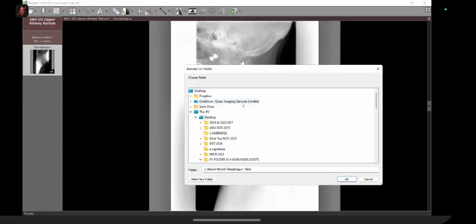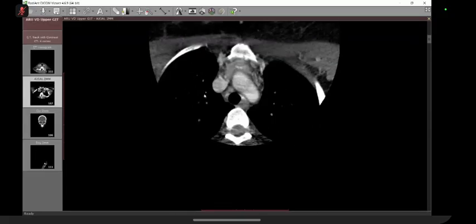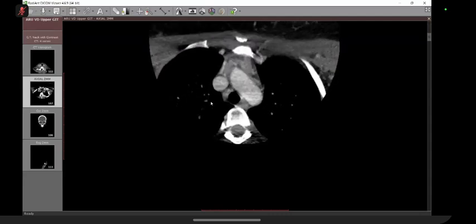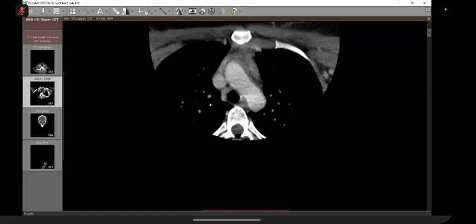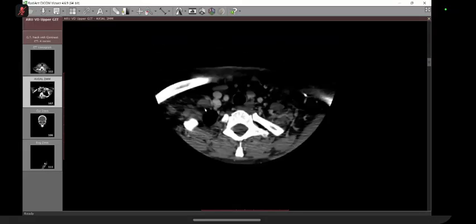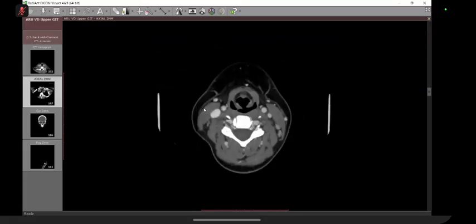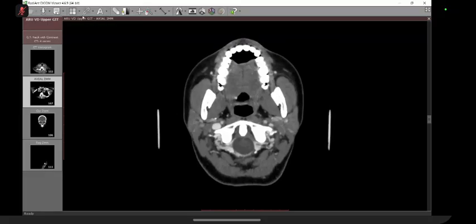Now let's go to CT. Now this CT, can you please confirm it is being projected to online people? It is. So this CT is too complex for you. Don't spend time. I put it for your workshop, but don't bother. I'm just going to quickly go through it.